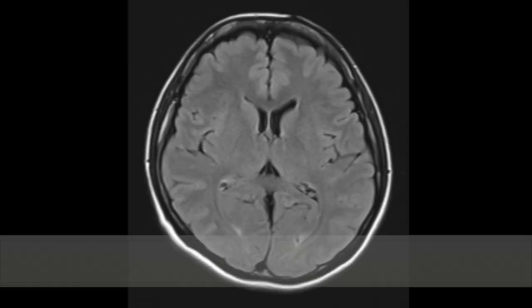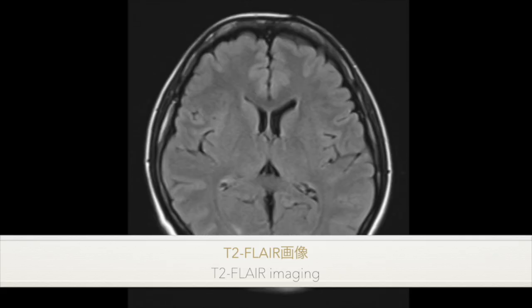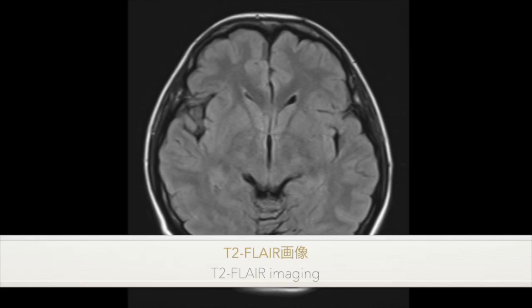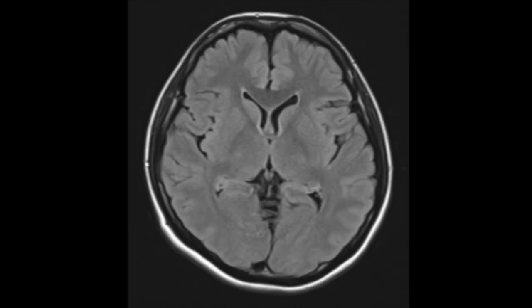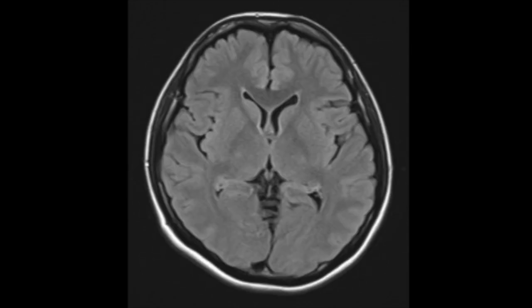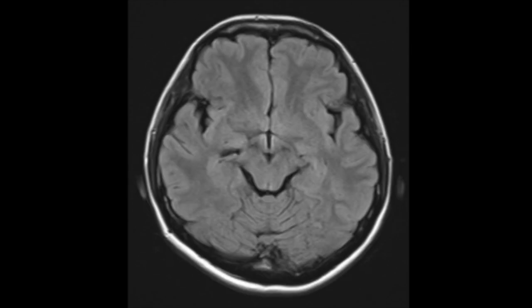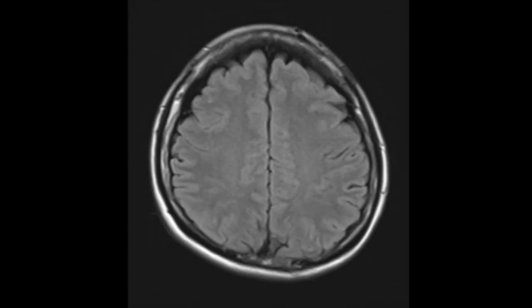The current image is T2 FLAIR, which often renders areas of encephalitis or other inflammatory lesions as bright regions. Where are the hidden findings in the image? There doesn't seem to be any area of concern. On the FLAIR image, there appears to be nothing specific to point out.